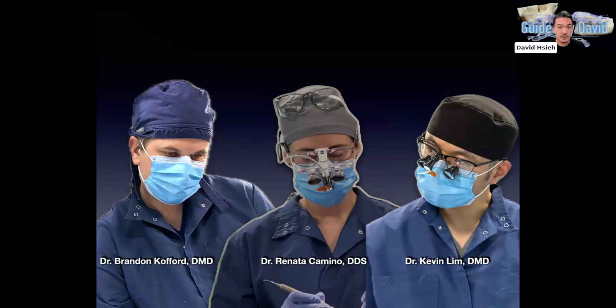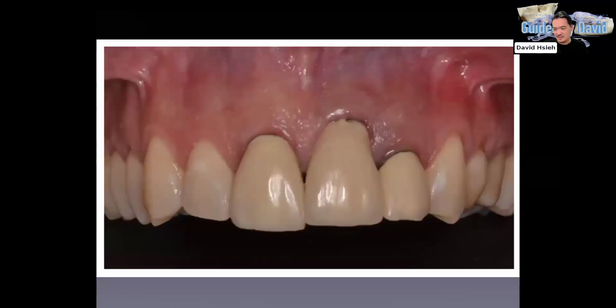So before we start, today we're going to talk about something easy, right? But even though it's easy, making things easy is not easy. Looking at this, this is an anterior single crown, and you can tell the gum line is not that even, right?